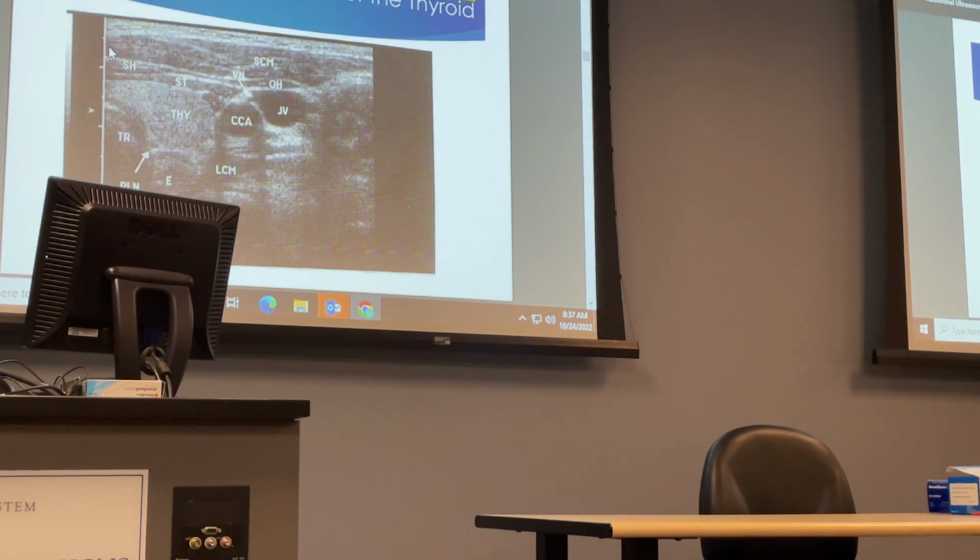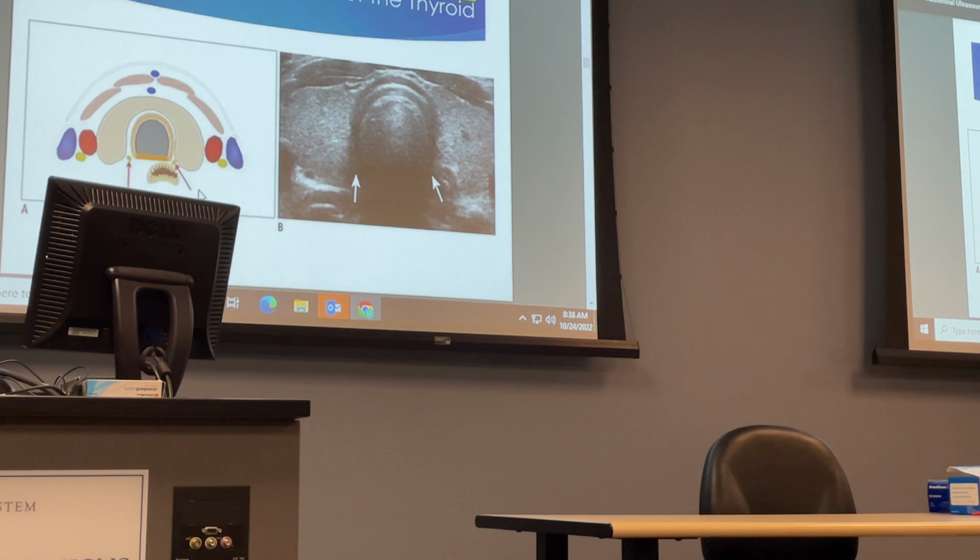The large muscle above all of those, all of this is what? Sternocleidomastoid. And last one, right underneath the thyroid gland, underneath that jugular vein, your carotid, all of this right here is what? Longus colli muscle. So make sure you are familiar with those muscles. Okay. This image, you guys just know everything for this image. I'm telling you right now. Okay?